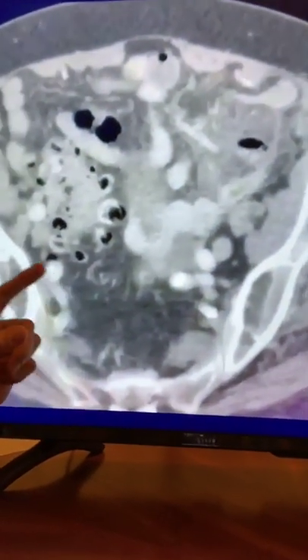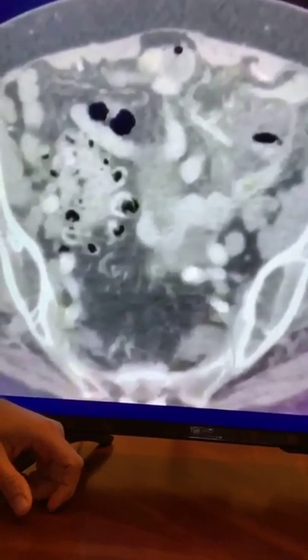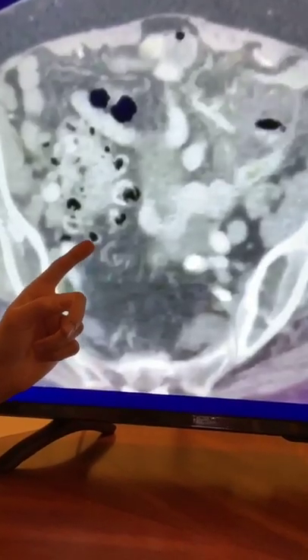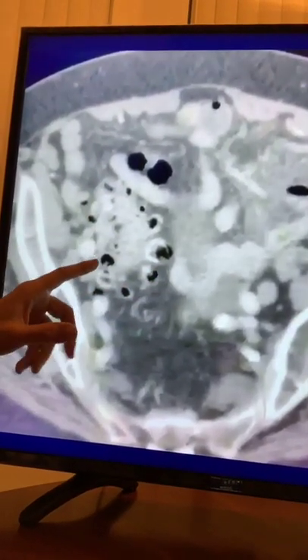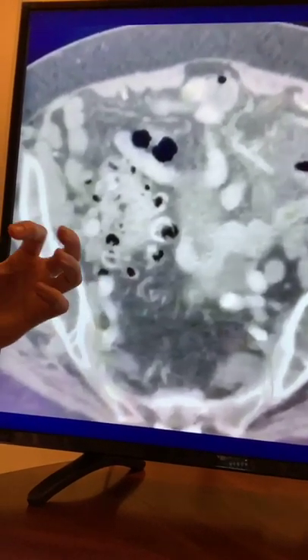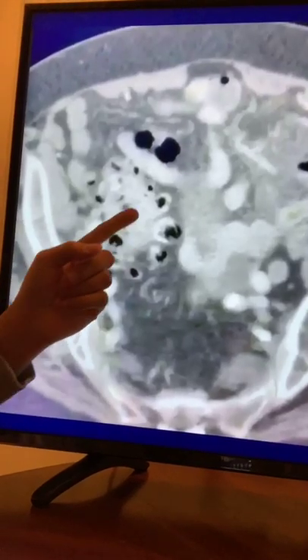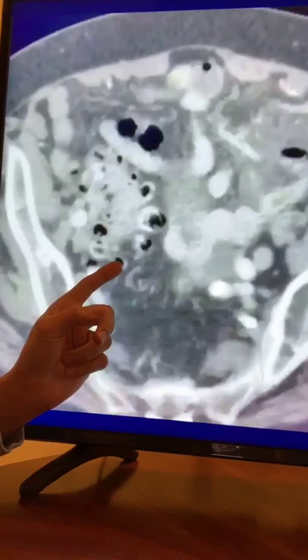Second image that I showed you guys is this one right here. Speaking of old people and common incidental findings that you're going to see in old people all the time, now that you've seen this, I don't know why, this just looks gross to me. It looks like there are little balls of feces basically all throughout the colon. This is very common in the sigmoid colon.